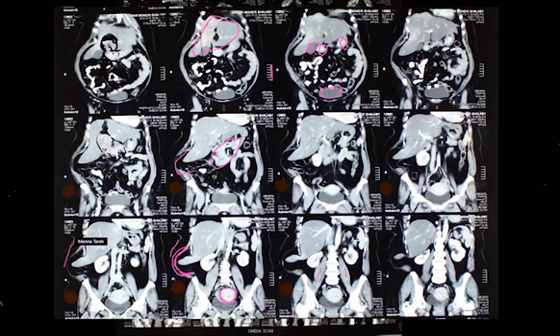Absolutely. She may not be obese. It would be better to say she has a normal or abnormal BMI. She may have a lot of subcutaneous fat and not be obese, and vice versa. Do not confuse the amount of subcutaneous fat with the overall weight. They're two different things. It's constitutional. You can all identify the subcutaneous fat as a hypodense area, the skin, and the bones as really hyperdense areas.